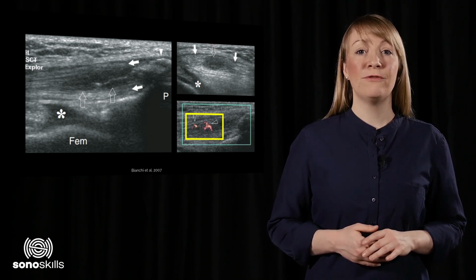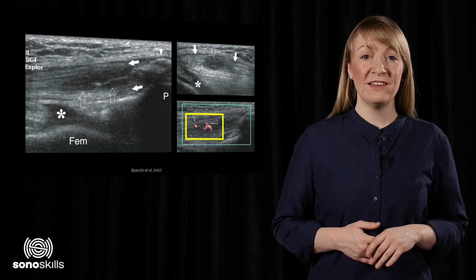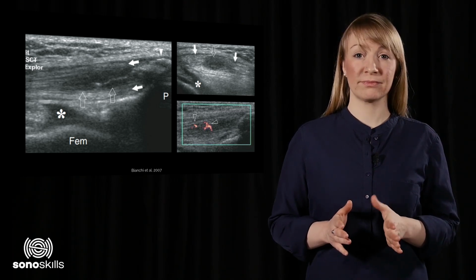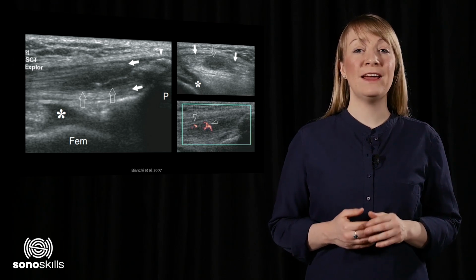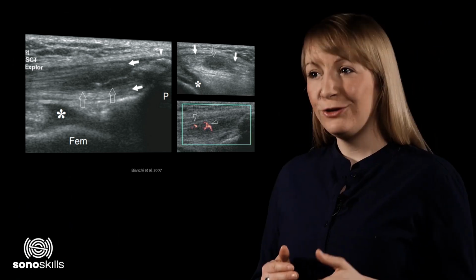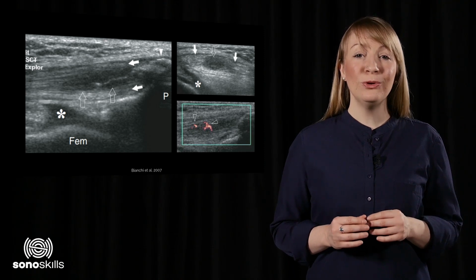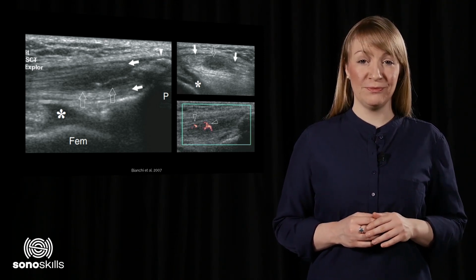Power Doppler of the longitudinal quadriceps tendon shows a moderate intratendinous hyperemia. Based on this static image, it cannot be confirmed whether there is a functional problem. We can assume, based on previous findings, that this patient shows a grade 2 partial tear with moderate hyperemia. Grade 2 means it's moderate and involving 25 to 50% of the height of the tendon. The tendon also shows a moderate tendinopathy and a pre-insertional calcification.